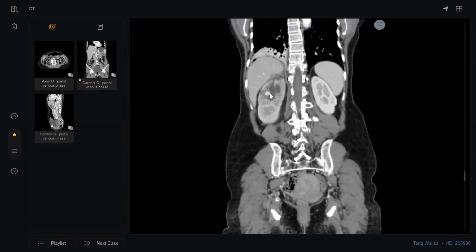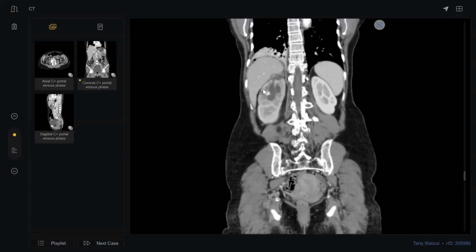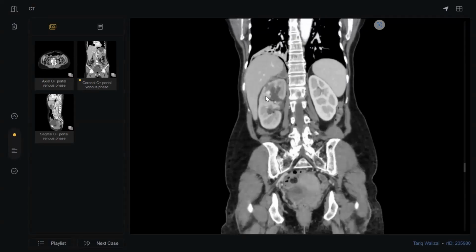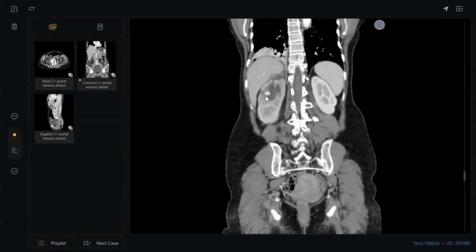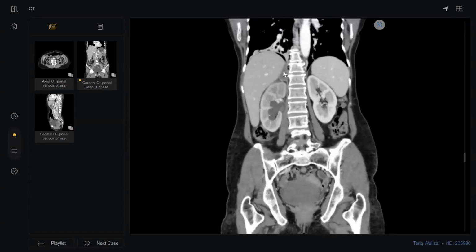Not active hemorrhage. This active hemorrhage you can see outside. But what happened here? This is an injury to an artery. So what is the name of this? Post-traumatic dilatation of the artery, pseudoaneurysm formation. Pseudoaneurysm, and what happened is possible.